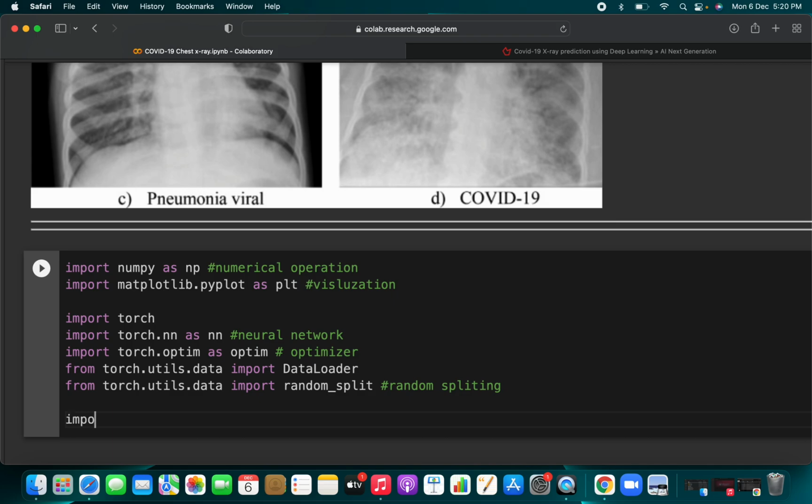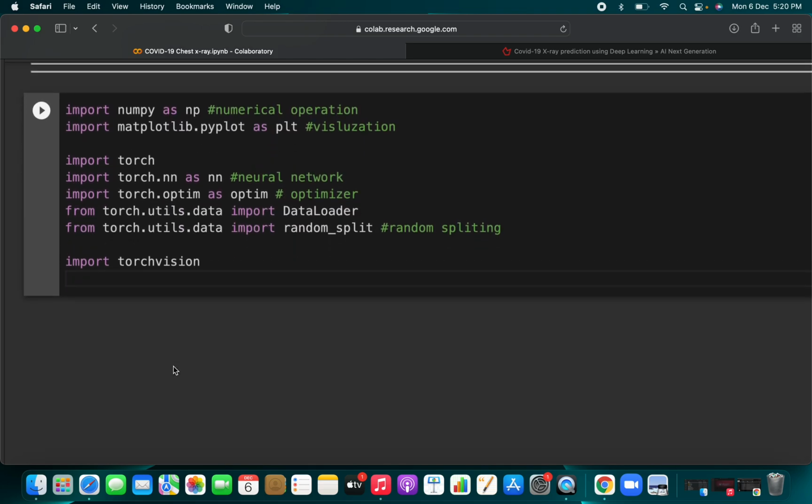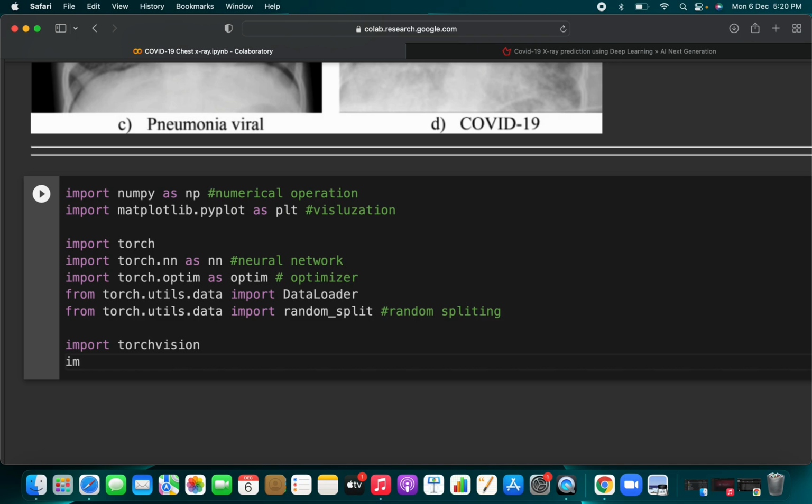Okay, first of all you are going to import torchvision. Sorry for that, you have to write torchvision. Clear. Then after that you are importing transforms, and I will explain this also. First of all, import torchvision.transforms. Okay, so what do you mean by transforms? Transform basically means you want to transform your image in various ways, like we have already said: you want to resize your image, or do image augmentation like horizontal flip and vertical flip, which you can do with the help of transforms.